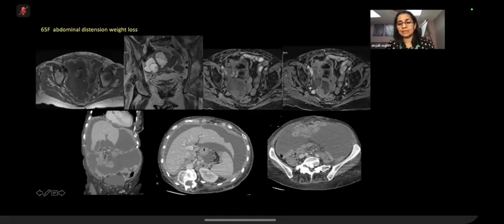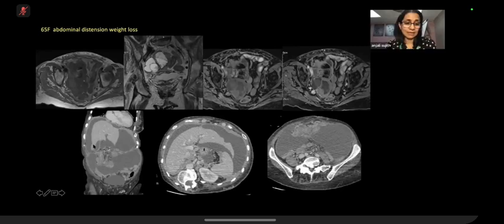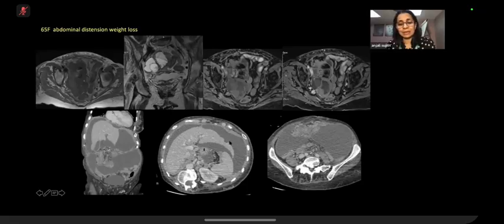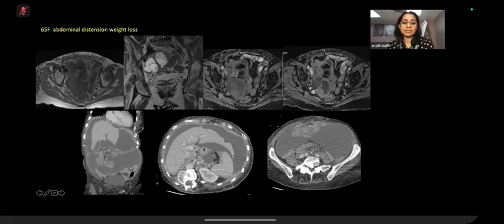Now, can you describe the CT findings? Okay, so on CT, I can see large pelvic abdominal ascites. I can see scalloping of the liver surface, most noted on the left lobe. Good. I can see also peritoneal thickening, parietal peritoneal thickening. Good. As well as some masses. What does this liver scalloping mean? It's pseudomyxoma peritonei. That's very good. It's a mucinous tumor. Good, excellent. So this is already metastasized to the peritoneum with omental cake. So it's already a stage 3 disease.